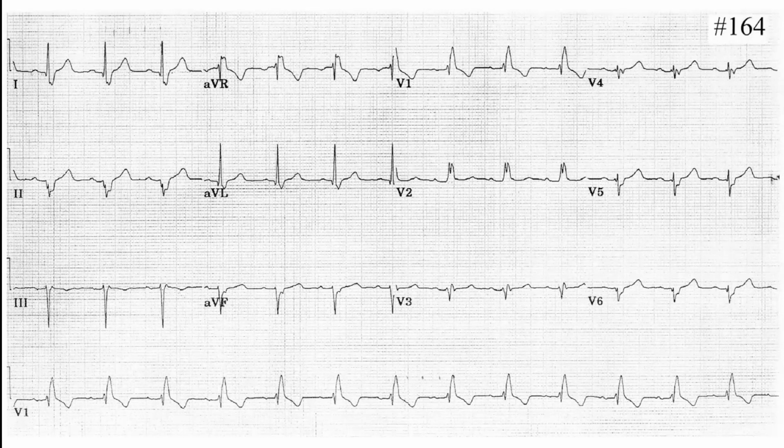So the rhythmicity is rhythmic. Yes, it looks like it's rhythmic. I can see the 1, 2, 3, 4. So it's normal, like 75. Okay, and now we start from the P wave. The P wave is fine. We do see a P wave in front of the QRS, positive in lead 2, negative in aVR. So that's a sinus rhythm.